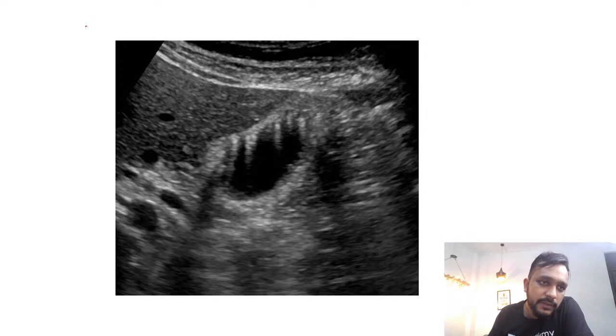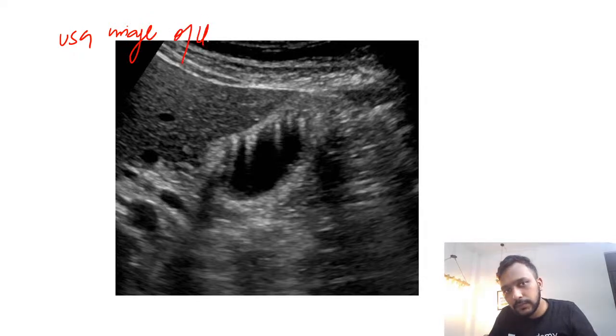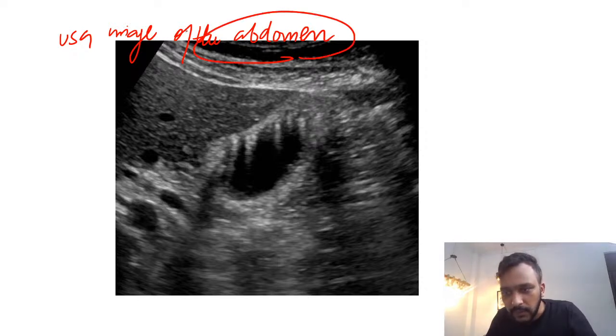Now, another ultrasound image of the abdomen is shown to you. What are you able to see on this ultrasound image of the abdomen? Anyone guys?